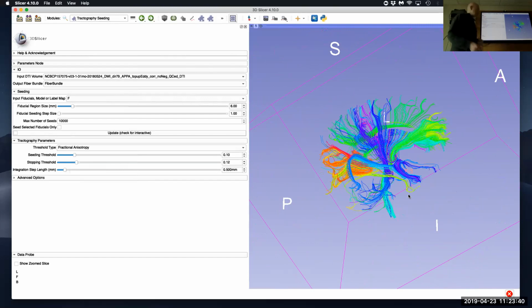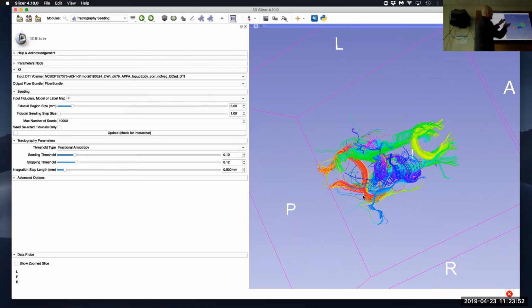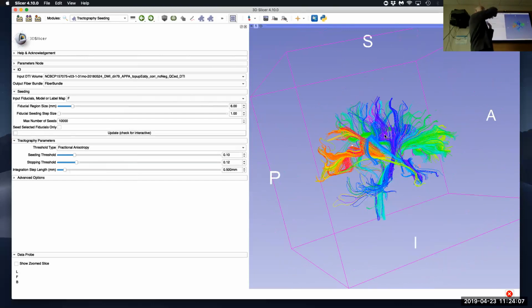I don't have an example here to load of a bad tractography, but what you would see is kind of like that: all tract seams, instead of going forward, let's say I would look at this from above, they would be kind of drifting. All would be drifting to one side or another side if there's an issue with the gradient, or it could be an issue where everything is drifting to the back. You would then see this one here kind of as if unwinding.